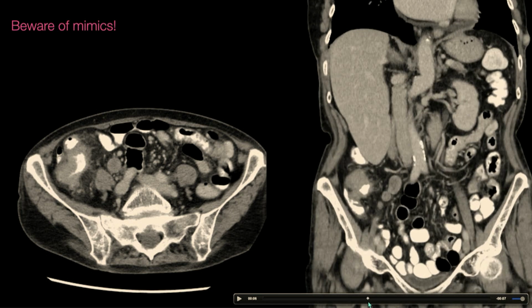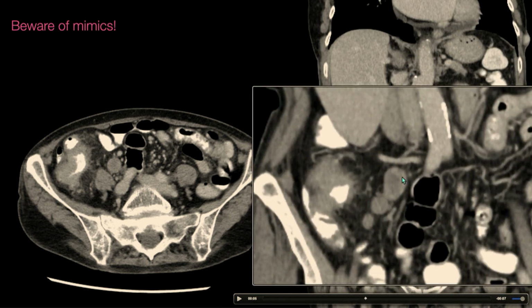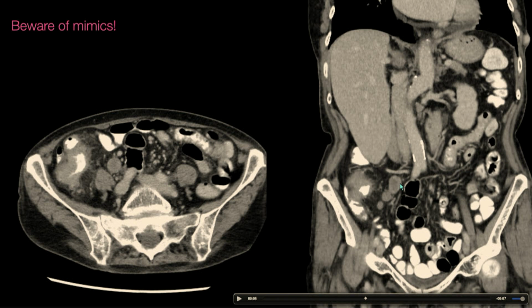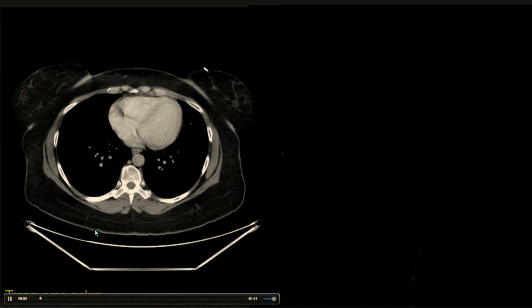And of course, like I mentioned earlier, you're going to look for secondary signs that support malignancy. And there are big, bulky, abnormal lymph nodes. So not only do we have big lymph nodes, but we have abnormal enhancing lymph nodes with heterogeneous low attenuation centers. So just keeping in mind, now we've crossed over that threshold from low attenuation inflammation into soft tissue density and ileocolic adenopathy, really raising our concern of cecal adenocarcinoma.